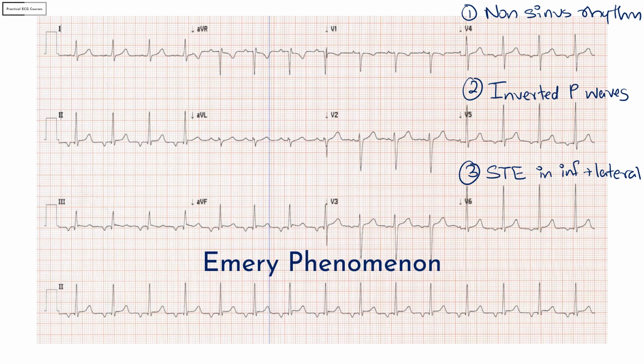So how would you evaluate a patient with ST elevation and inverted P waves? As always, consider the ECG in its clinical context. If the patient is low risk for ischemia, he may not need much investigation. However, if the patient is high risk for ischemia, you will need to evaluate thoroughly just to make sure that there is nothing else going on. Remember that patients can have two problems going on simultaneously. So to summarize, this patient has a low atrial rhythm and no ischemia.